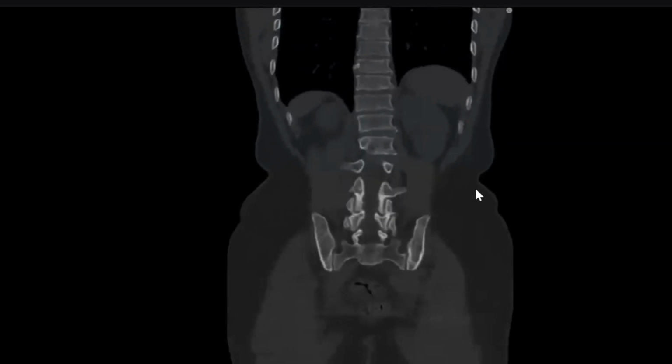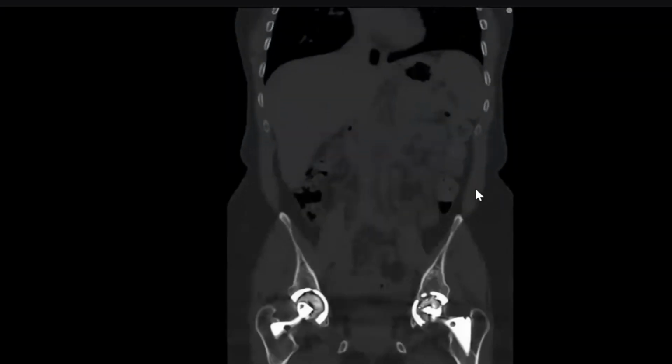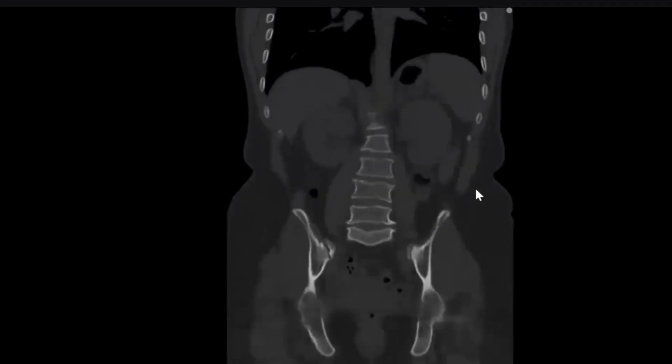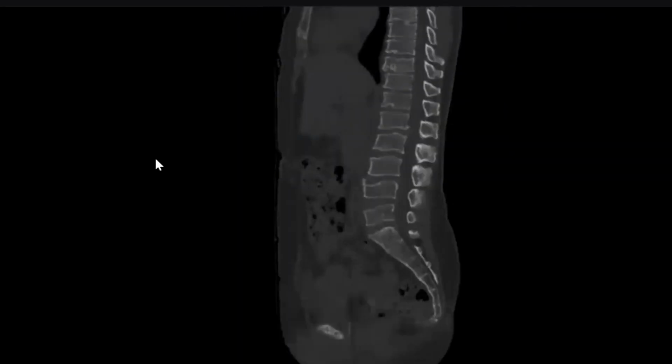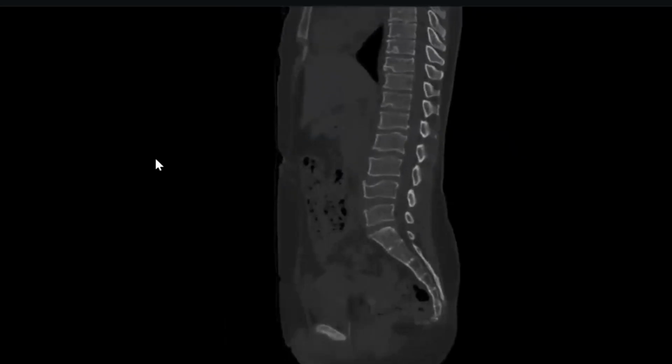And the second point in sickle cell, do you think this is the acceptable texture for the whole? No, sir. Can I see the sagittal? It can be Scheuermann's disease. What is the name of this multiple end plate defects?